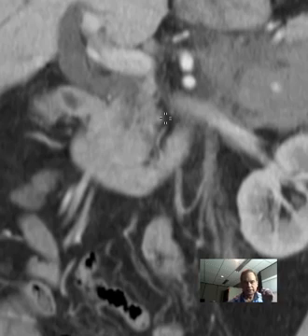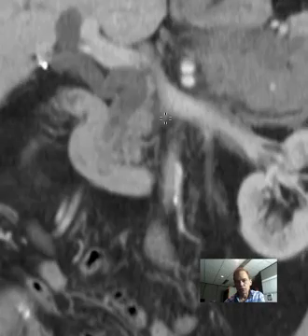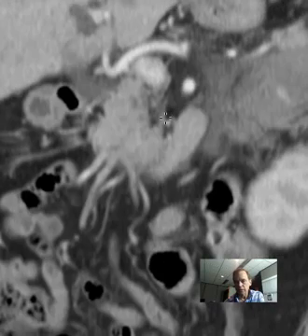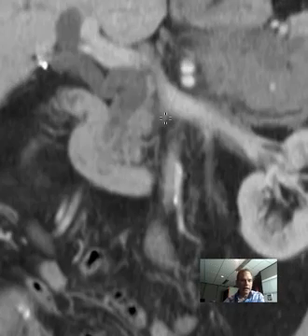Now you have an idealized picture in your mind of what this anatomy is, and you will see that there's a tremendous amount of variation. So it's not the actual picture in your mind that you want. You don't want to see the way it's supposed to look. You need to have the concept of what the anatomic relationships are, and you will see that those anatomic relationships are fixed, but the exact appearance is highly variable.